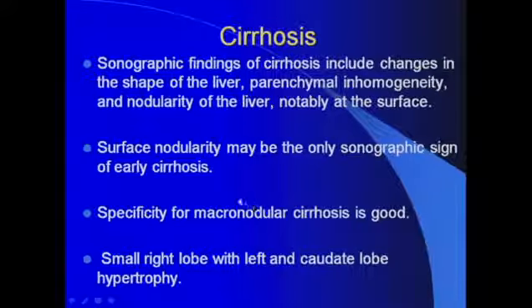Now, surface nodularity is really specific for macronodular cirrhotic change, if you see it. Micronodular changes are not really picked up by sonography, and most of the time the diagnosis is made by pathology, i.e. on a biopsy.